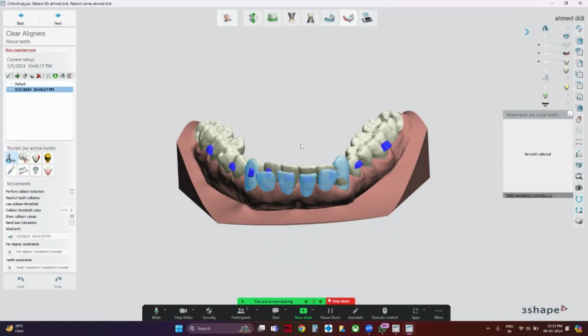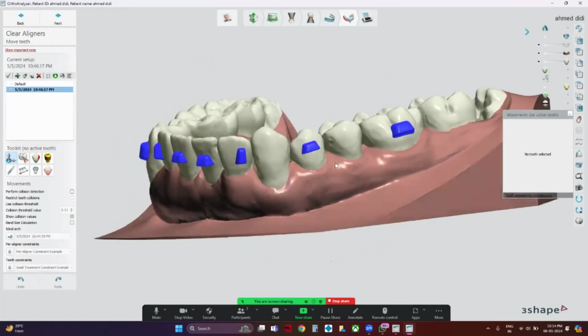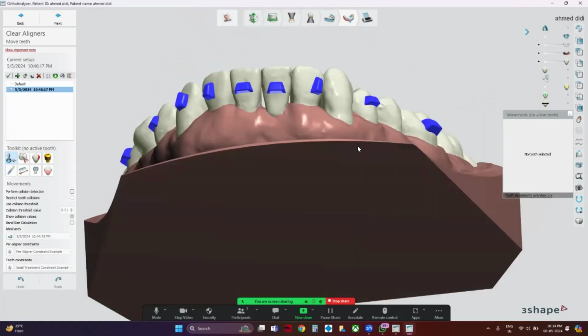Then if we are clear with this, I will move on from this case, and I want to show a few things, and then we'll come to Dr. Karanjit's doubt also. I have a question. After you have done that staging part, you have taken it to 5, then how do you export it? And when the export comes, will it show that upper is showing 5 and lower is showing 19?